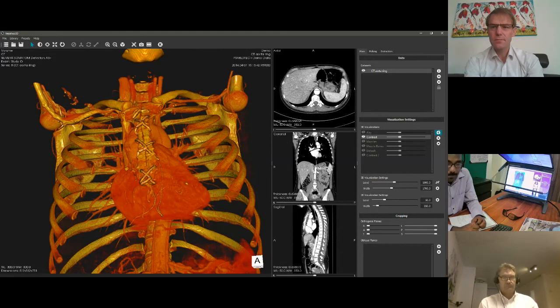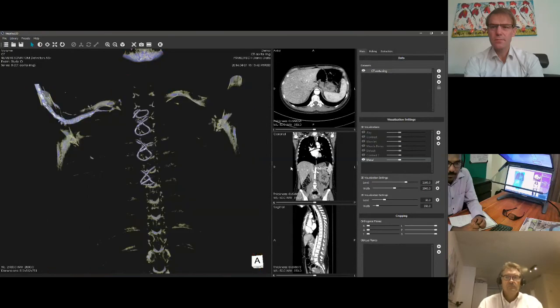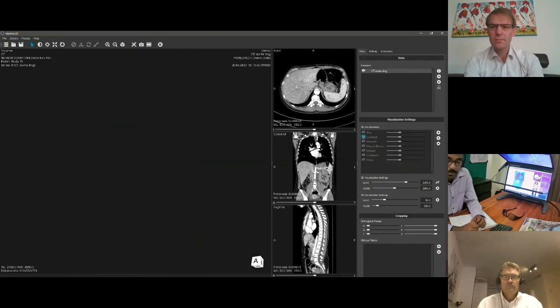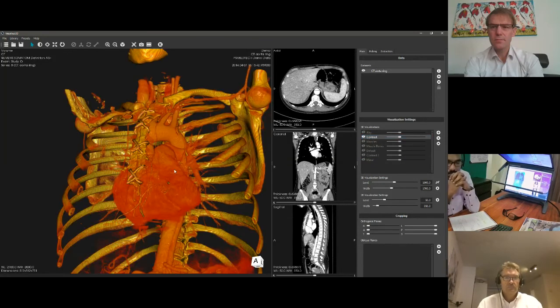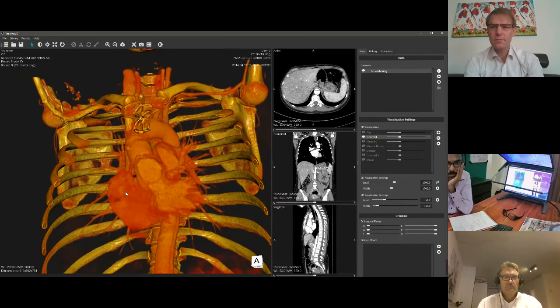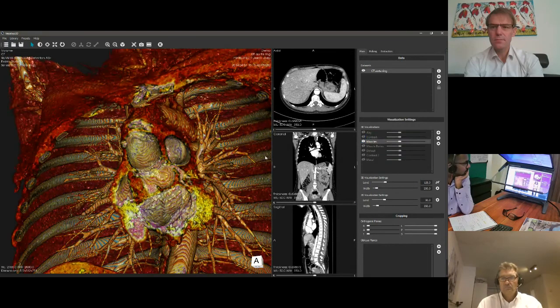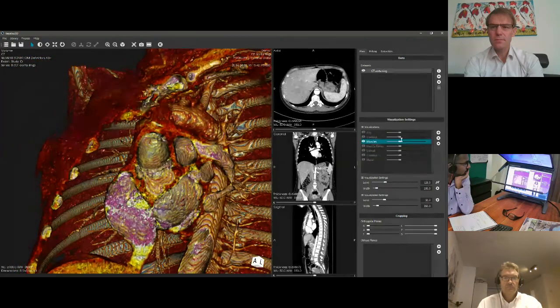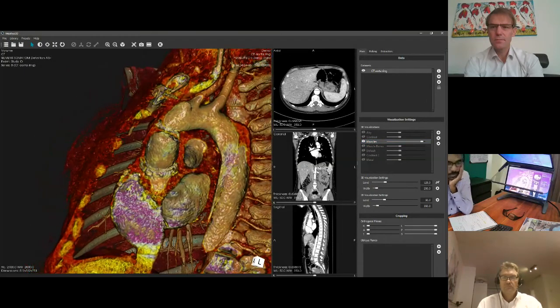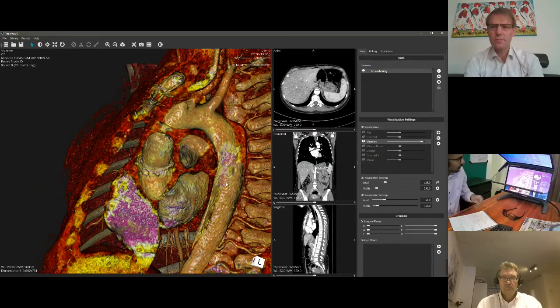And if you want to see what kind of stitches they are, I will show you the metal. And suddenly you can see that that is the work of a previous doctor. And now I'm showing you here, and we're going into this patient, zooming in. And suddenly we're flying through the patient. And what we have over here is a huge coarctatio. And suddenly we see this split, this rupture in the aorta.